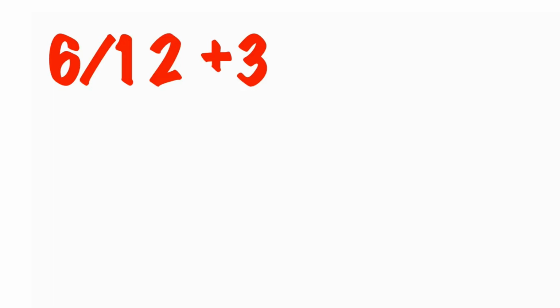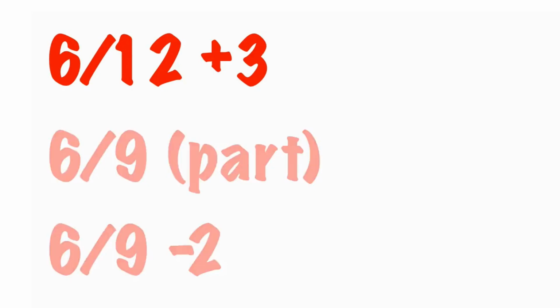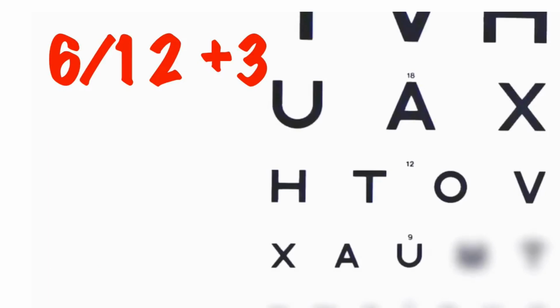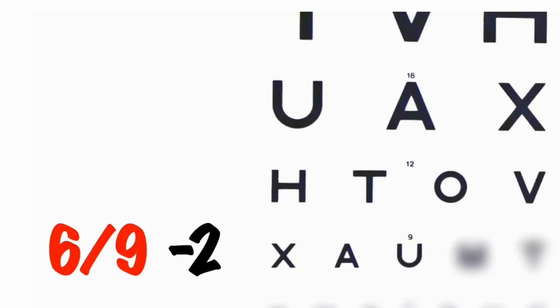Sometimes you may see VAs expressed as 6/12 plus 3, or 6/9 partial, or 6/9 minus 2. Confusingly, they all mean exactly the same thing, that the patient can read down to line 12 and get 3 letters from the next line down, part of line 9 or all of line 9 apart from 2.